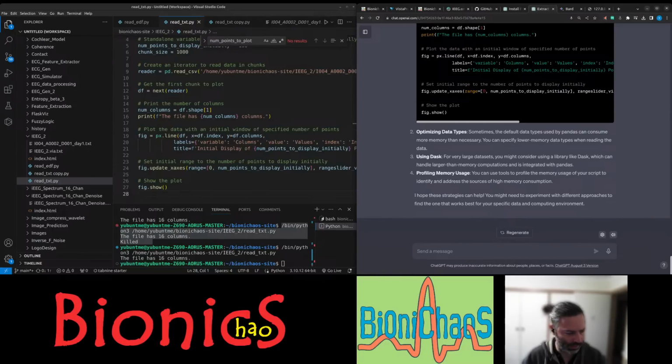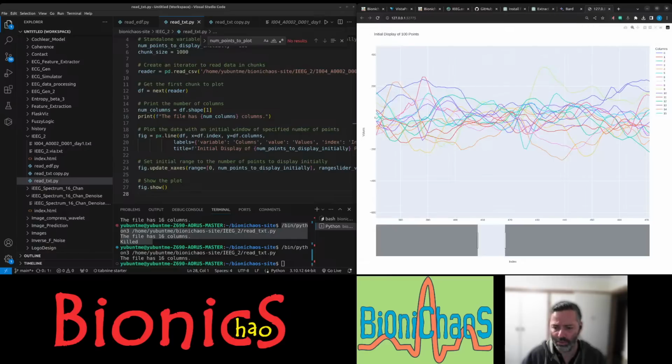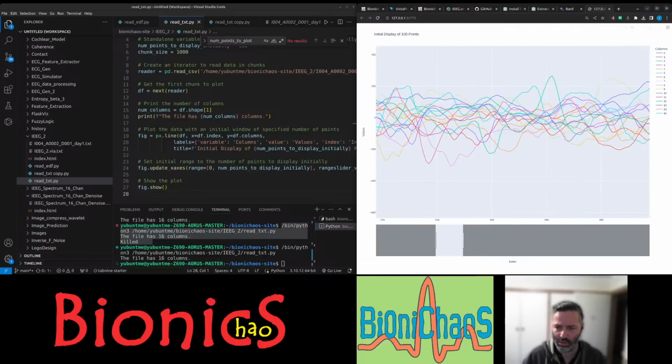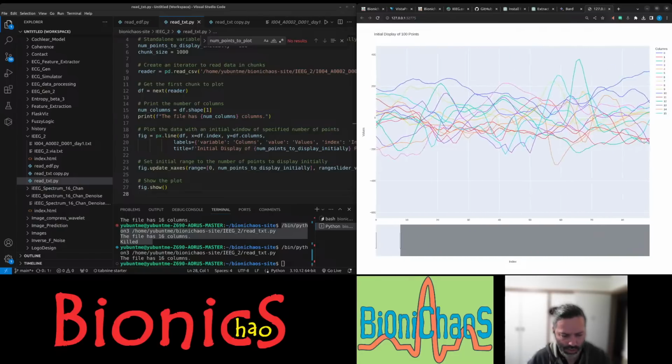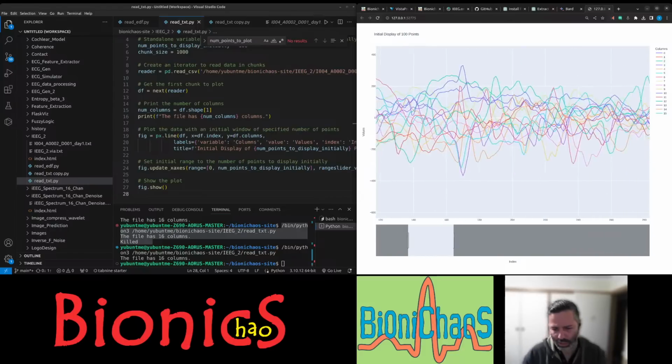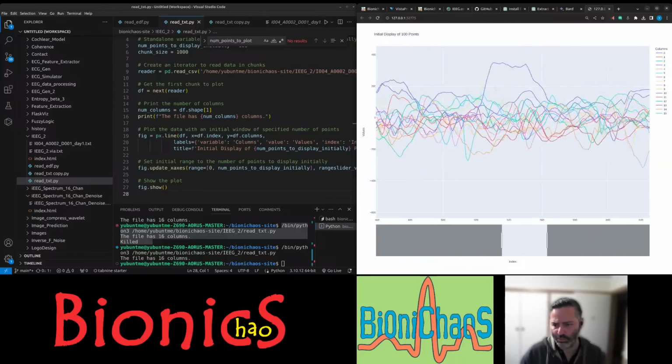So I didn't realize we've been in this stream for over time. But yeah, this looks really good. You can set the number of points that are loaded. Yeah, we need to fix those edge cases.